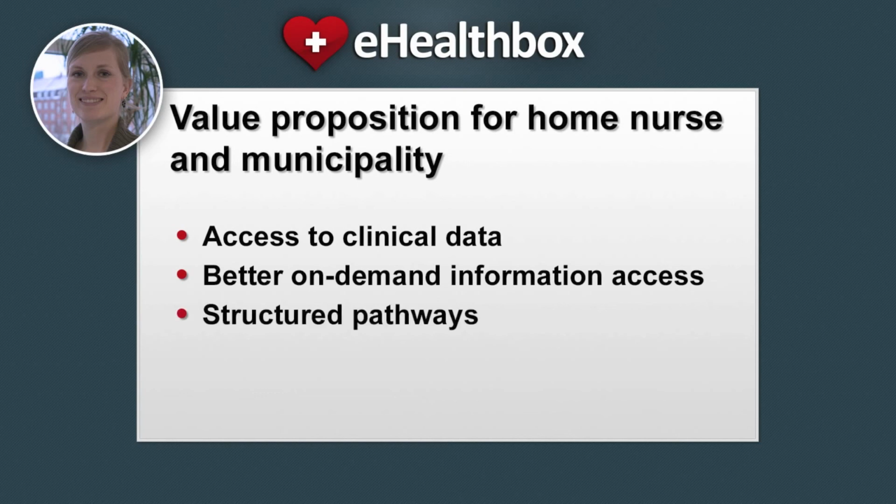The eHealth box offers the structured pathways that also give the home nurse a standardized and structured pathway to add data and results about the citizen's chronic disease.